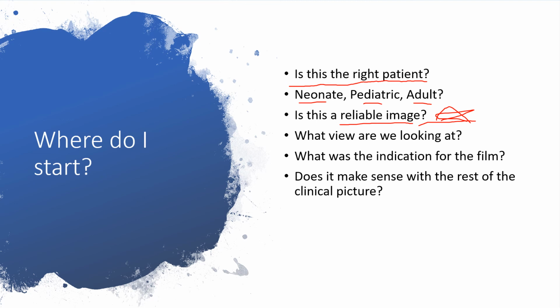So if the cassette, that little thing that they put behind someone's back, if they put that behind someone's back, and it's usually a portable X-ray is where these are going, those can be good for looking at line placement and some basic things, and I'll have a comparison in here as far as diagnostics go. If we're looking for lesions, things like that, that's not going to be as valuable. It's still valuable in some aspects, but if you can get a diagnostic X-ray for the right person, that's going to be best. So PA is going to be one of your better ones.